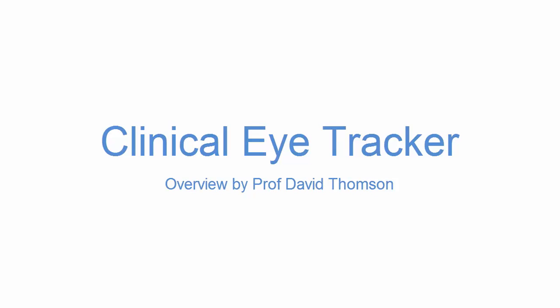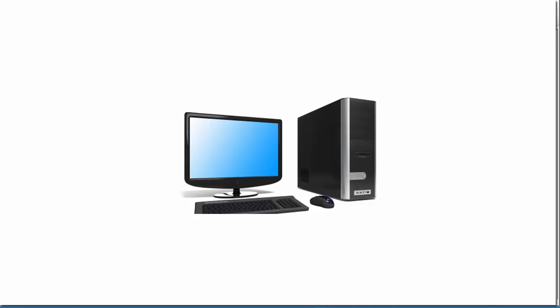So in this brief video, I'm going to show you basically how the clinical eye tracker works. There will be other videos posted on the website in due course, which will take you through some of the features in more detail. But I want to just give you a quick overview of how it works in this video. So the clinical eye tracker software will run on most PCs running Windows 7 or later.